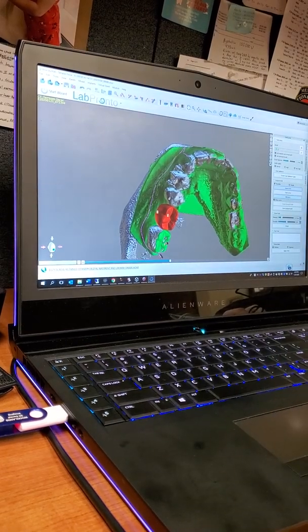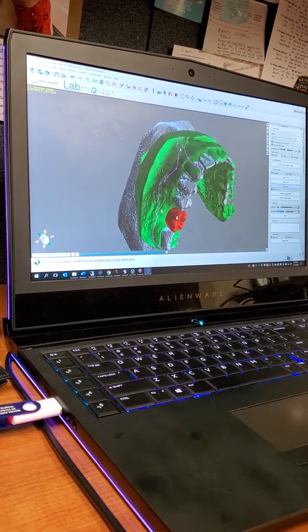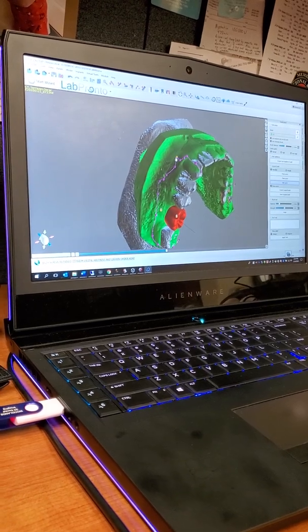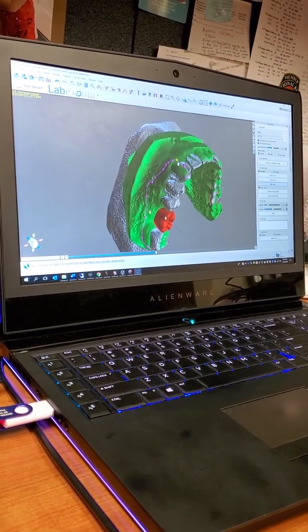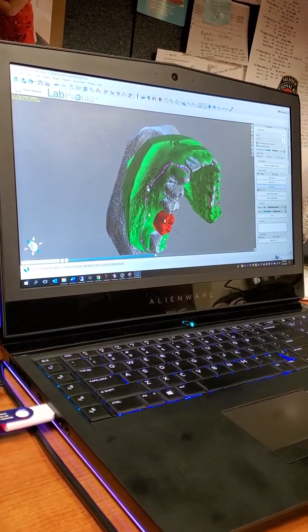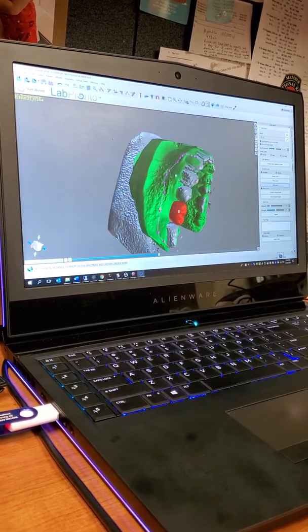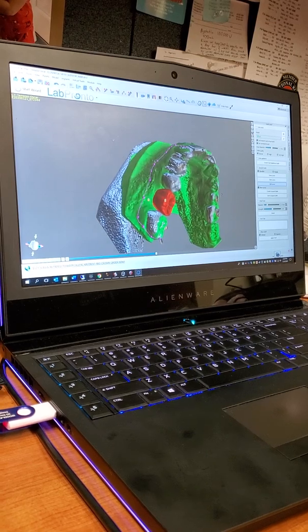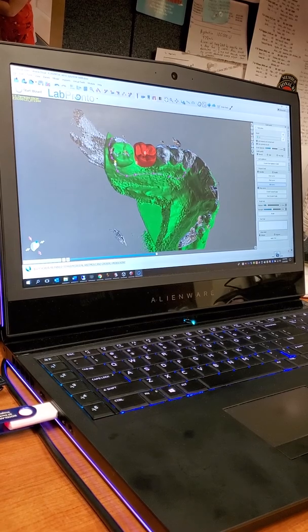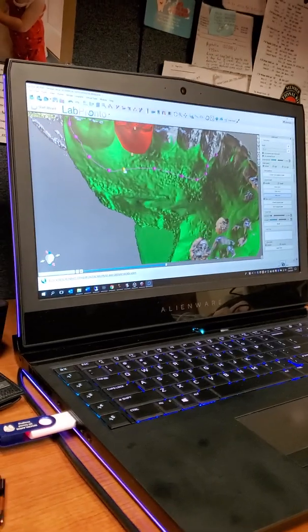Alright, then I go to edit curve, and it'll show you all the little points that you created. So I'm going to start dragging these points and creating kind of a smooth contour for where I want to make the guide. So it's not anything that's too fancy. You can make it longer, narrower. You get kind of a feel for what you like. I usually include the occlusal of a tooth behind it just so that it gets it. And you can see those points are reasonable.